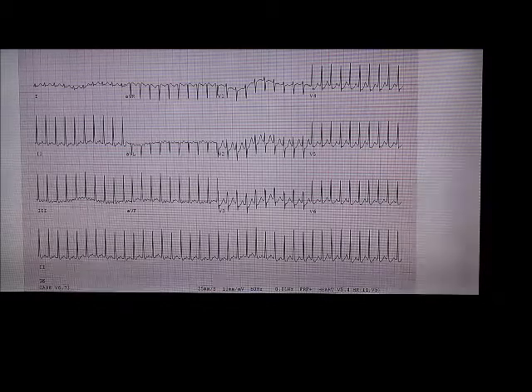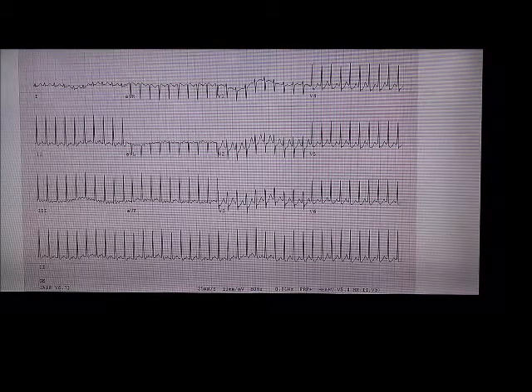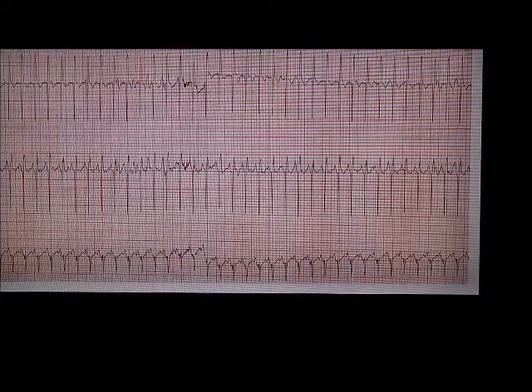So what do you think of this one? Rehan. Short RP. Short RP. Oh, mid RP, if you want to go with that differentiation, but yes, it is short RP.